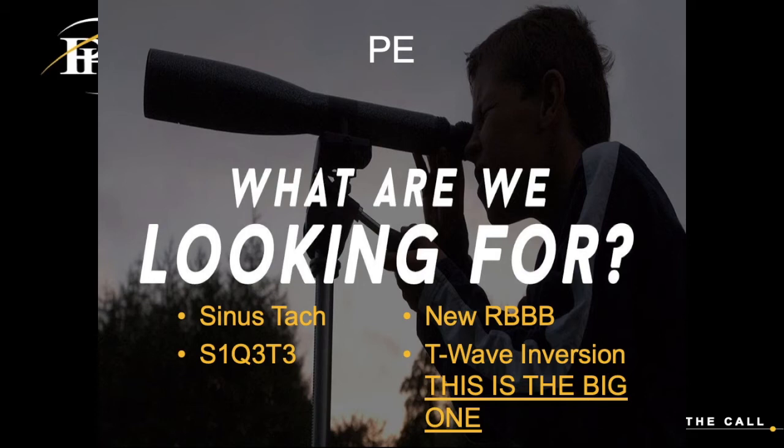The big thing that we're looking for is a new onset right bundle branch block, and we are looking for that T wave inversion in leads V1 through V4. So we're looking for that anteroseptal T wave inversion. And if we also have T wave inversion in the inferior leads, that is more specific for a PE than anything else.